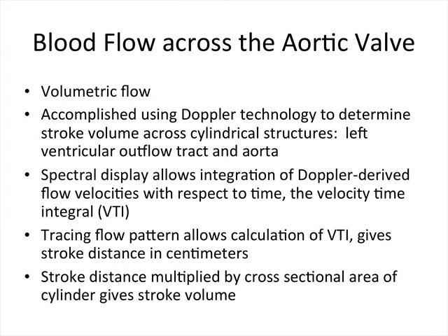In order to calculate the aortic valve area via the continuity equation, the volume of blood that flows across the left ventricular outflow tract must be known. This is referred to as volumetric flow. This first step toward calculating aortic valve area is accomplished using Doppler technology in order to determine stroke volume that flows through the cylindrical structures of the left ventricular outflow tract and aorta.